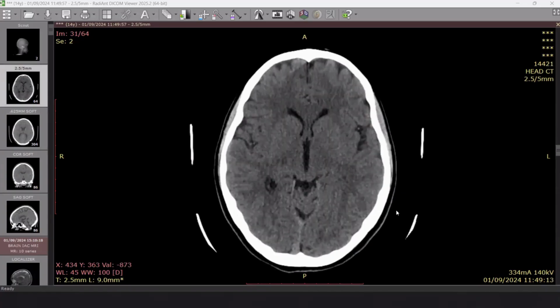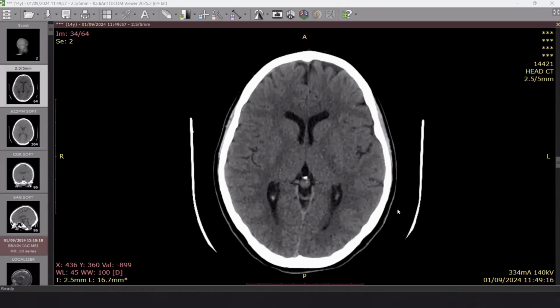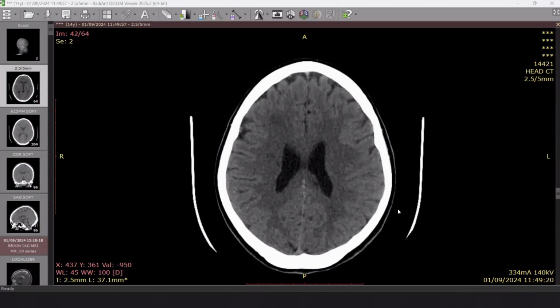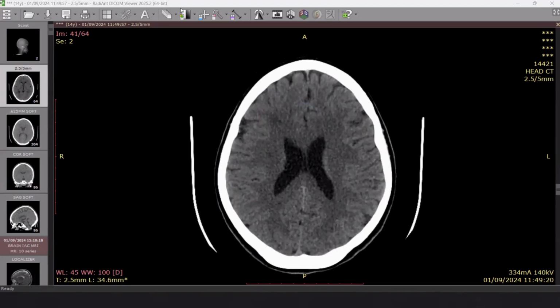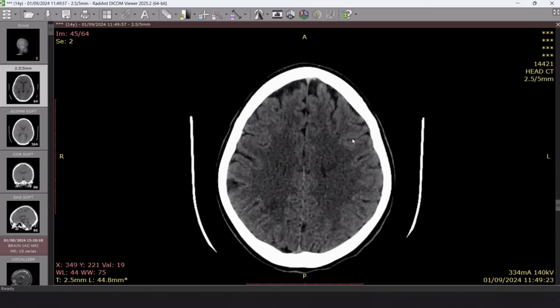Can you check again the subcortical white matter as you did here, because you picked up the most difficult one, really. Once we have something like this, we should modify the window. We have something abnormal on the right side.